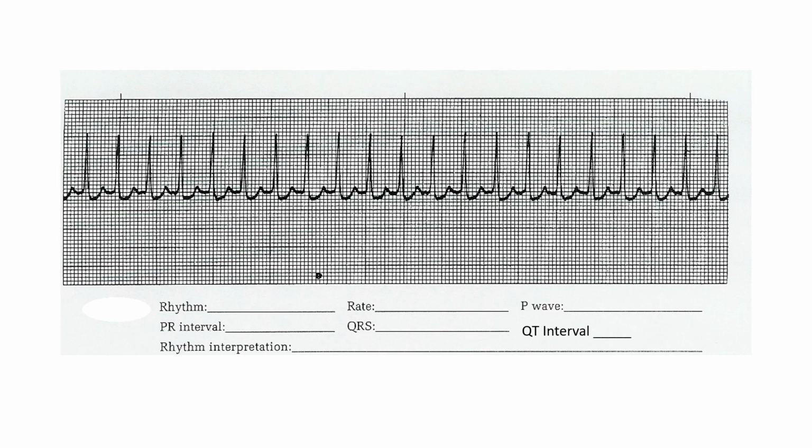P waves, you can't see them. They're obscured. You can't tell what's a T, what's a P, so you're just going to say, unable to see. So you can't measure a PRI.